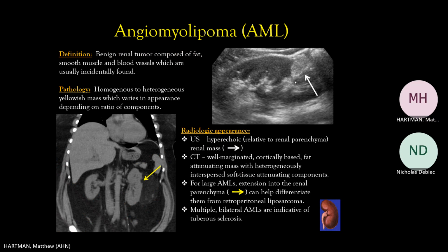Angiomyolipoma. For an ultrasound, we have an echogenic lesion. If we remember what is bright on ultrasound, fat, calcium, or air, we get the CT showing this is a fatty lesion, approximately negative 100 Hounsfield units, AML.